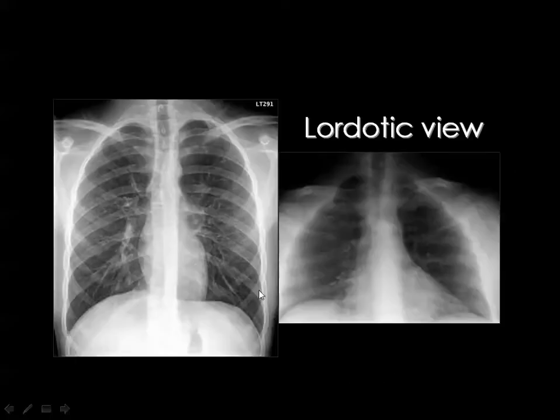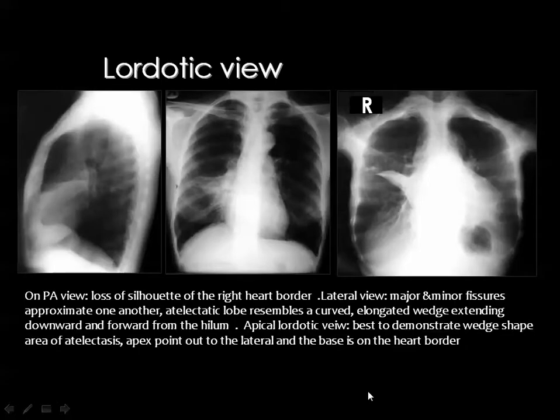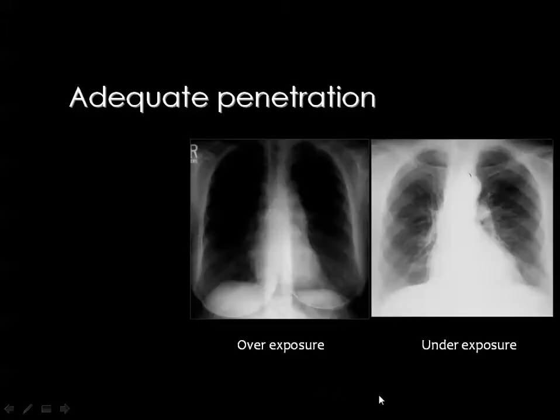And this is also an example of the normal chest posterior view and the lordotic view, displacing the clavicular shadows away from the field of view in the apex of the lung. Also, one of the values of the lordotic view is to augment the appearance of middle lobe lesions. Here this is the frontal chest X-ray, and you see an opacity in the middle lobe which is relatively projected anteriorly in the lateral view. The lordotic view clearly demonstrates the lesion in the middle lobe.